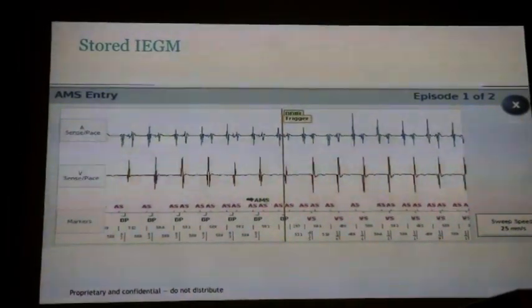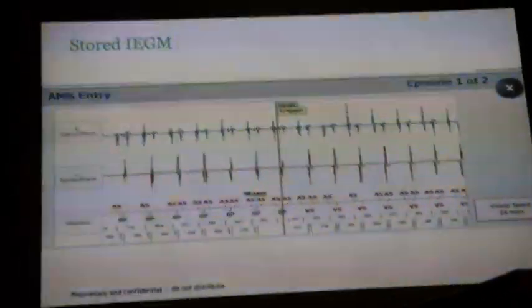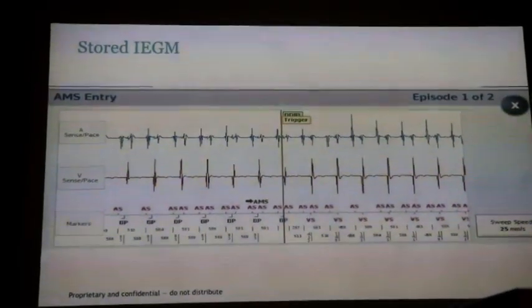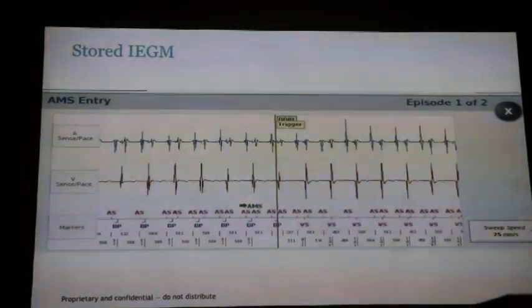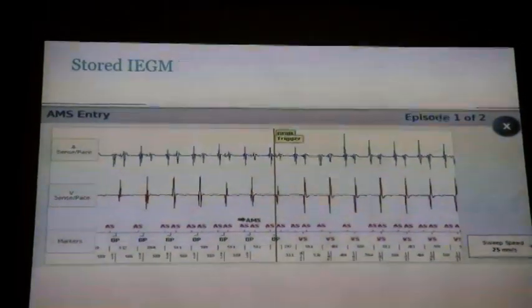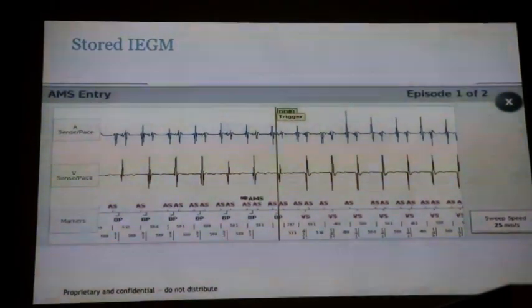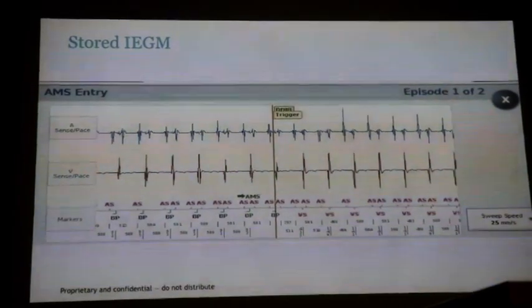It's outside PVAB. If it's in PVAB on an Abbott device, it doesn't say anything. We don't give you any marker. It doesn't see. Other devices give you a blank AB, so they'll tell you that it's in the blanking period. We'd say if it's in blanking, it's fine. Yesterday we saw a similar case with this marker, and it said AR, that's A in the ventricular refractory period.